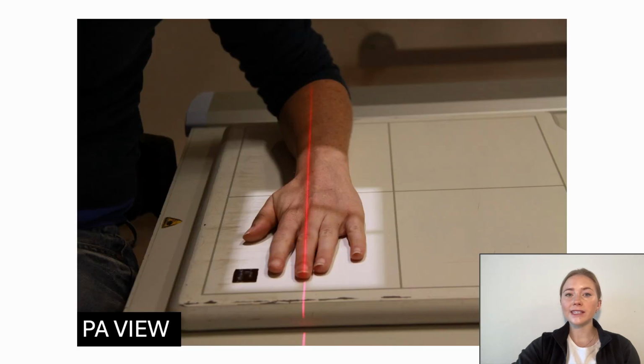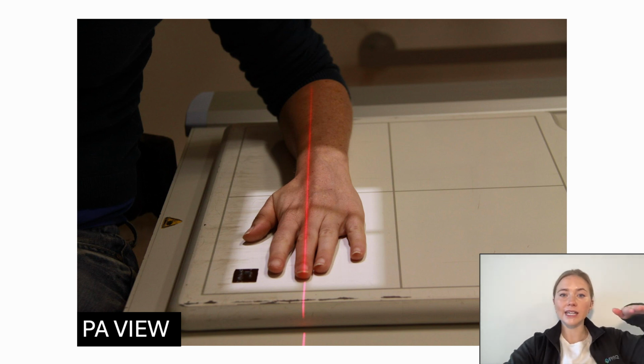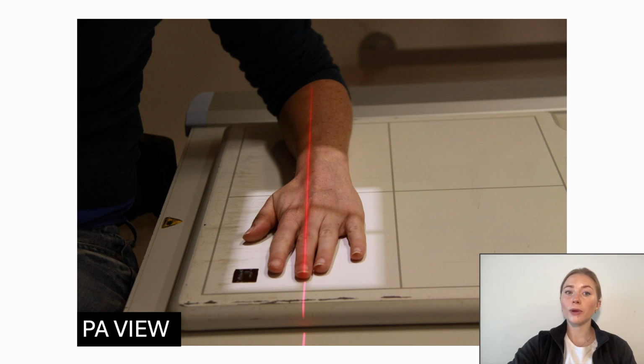The posterior anterior, or more commonly known as PA view, is great to see the fingers in anatomic position. The patient has an X-ray taken with their hand resting on the table, palm down, as seen in this photo. This is used instead of the anterior posterior, which would be palm up, because it naturally encourages straightening of the fingers. There are certain situations in which you would use an AP view instead, often with bent fingers called the ball catcher's view, which can reveal changes indicative of pathologies like rheumatoid arthritis.